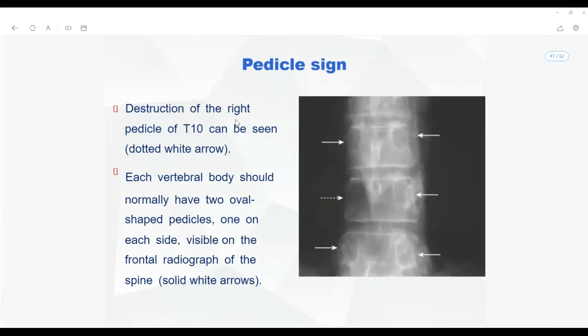Okay, you see, this is the pedicular part, and you see here when we compare it to the right lateral surface of the vertebrae, this is the T10 vertebra. Well, it might be difficult for you to understand because we have already removed the concept of spine because of the time, but it is included in the practical slides: normal anatomy, how to recognize the vertebrae and other things.